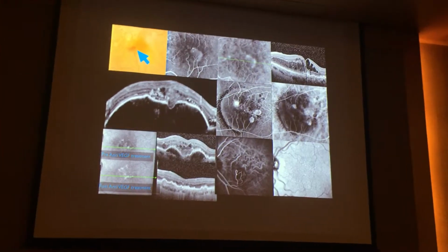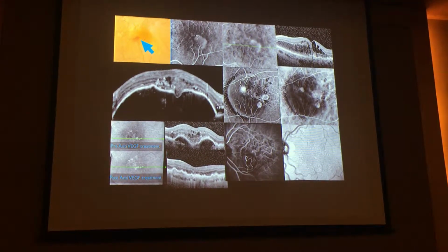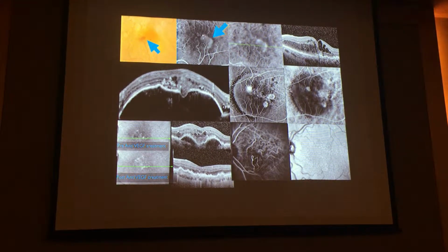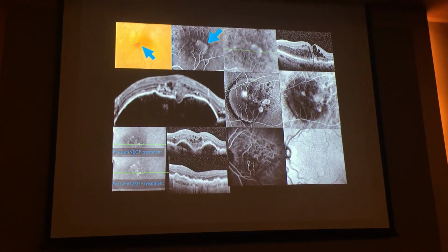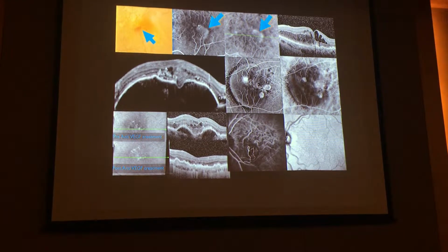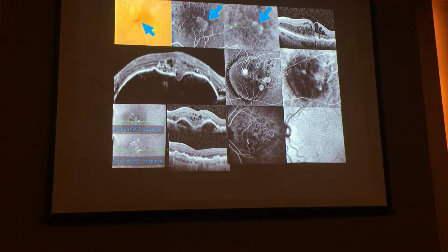As I told you before, particularly with ICG, where you actually have a reference as a choroidal vasculature, so you actually see deeper, you actually see the floating lesion, like here. It's between the retinal vessel and the choroidal vessel. Then you have another very important point, leakage in ICG. You don't have leakage in ICG except for central serous chorioretinopathy. So it's quite easy if you use ICG.